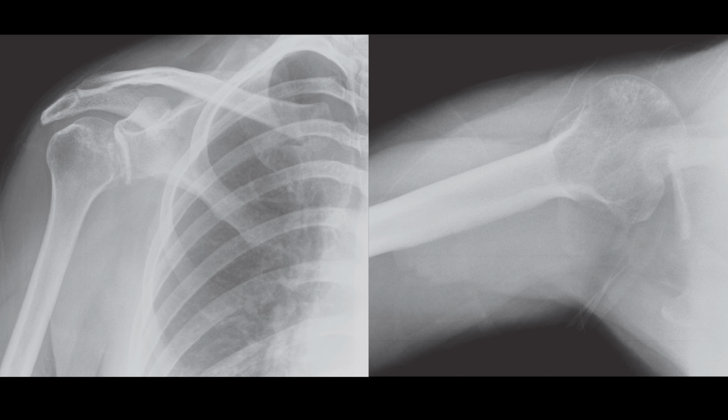Based on these findings, the diagnosis is an impacted posterior dislocation of the humerus with a very large reverse Hill-Sachs defect, suggesting that the dislocation has been present for about 3 months. Such cases often require surgical intervention, so correlating these imaging findings with the clinical history and discussing the case with the referring clinician is crucial for planning the next steps, likely involving surgical reduction.